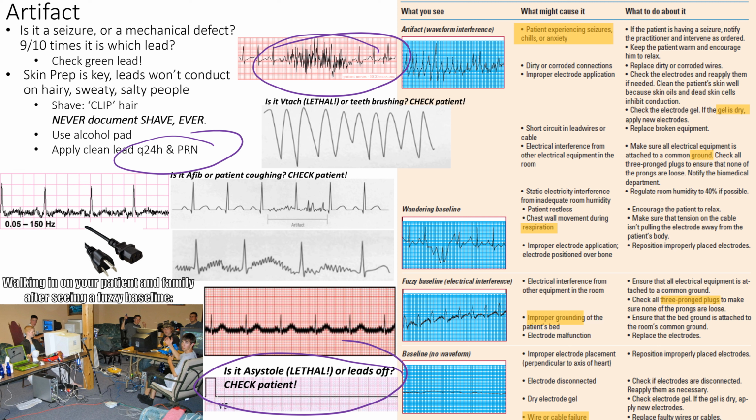Okay. Sometimes there's something called 60 cycle interference. That's where they have a LAN party going on in the room. You walk in the room, and it's like, what is going on here? I can't tell you how many times people brought in their own TV. They got two computers hooked up, and they got their PS5 going. So yeah, we can't be doing this. Dad needs to, A, rest, but also B, we're causing some interference.